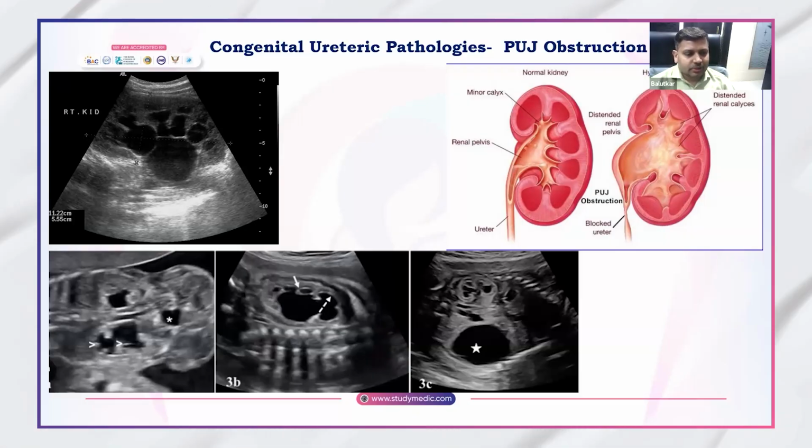of hydronephrosis. In the antenatal ultrasound images provided below, we can see both the kidneys of the fetus are dilated. We can see the renal parenchymal thinning. Even in image 3C, we can see severe dilatation of the pelvicalyceal system, and the renal parenchyma is severely thinned. Again, there is grading. We can grade the dilatation of the pelvicalyceal system.